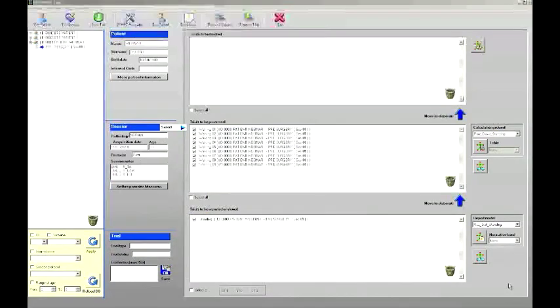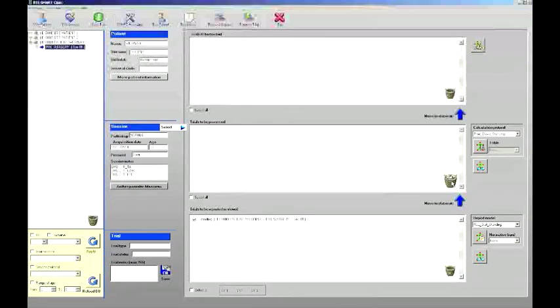Now you can see that all the trials are in the second panel, ready for the processing. During the working trials processing, you have only to define the gait cycle events, because the elaboration of all the gait parameters was already developed. We suggest to elaborate the working trials one by one, so click on the bin icon to empty the panel. Pay attention, you are not really deleting the trials, but you are only cleaning the panel.